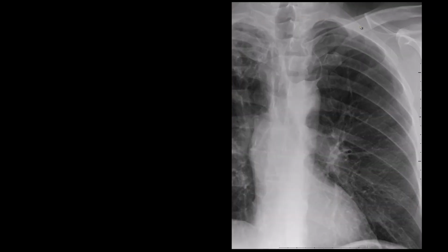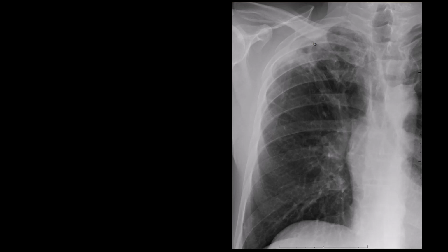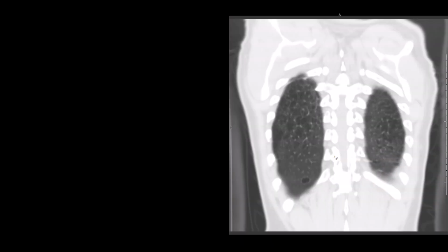So on this chest x-ray, if we zoom in on the left upper lung, you can see that there's a paucity of lung markings here in the upper left lung. And so that's an indication that this patient has emphysema. We also have a big bulla here in the medial left apex. And then if we go over to the right, you'll see that there's this asymmetric airspace opacity in the right apex with this central area of lucency and some adjacent pleural thickening.